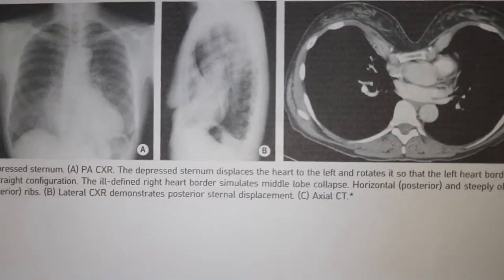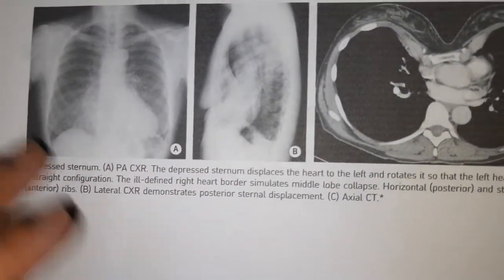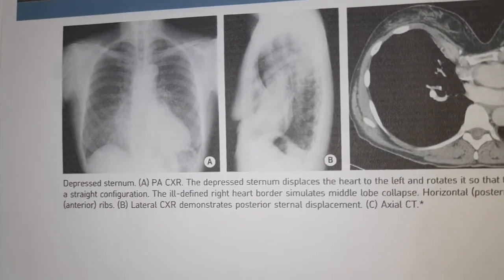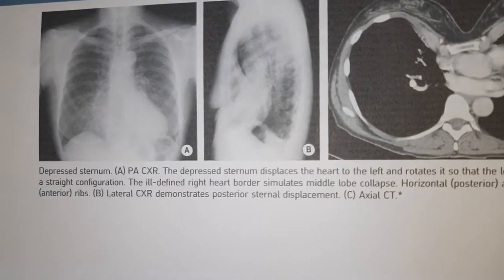This depressed sternum has a name. It is called pectus excavatum or funnel chest.